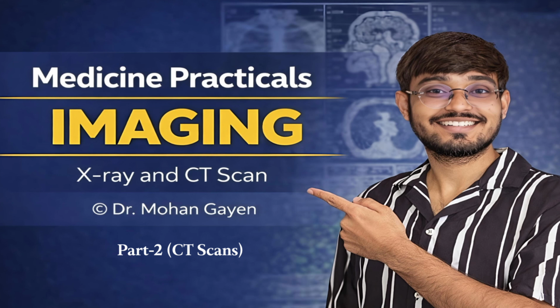We want you to understand exactly how these pathologies are decoded in real time. And to do that effectively, you really have to adopt the systematic approach of a radiologist or a neurologist. You can't just glance at the film, right? No, you don't just glance at it and wait for a lesion to jump out at you. You interrogate the image from the outside in. From the skull inward. Precisely.